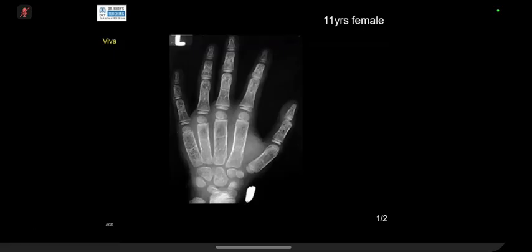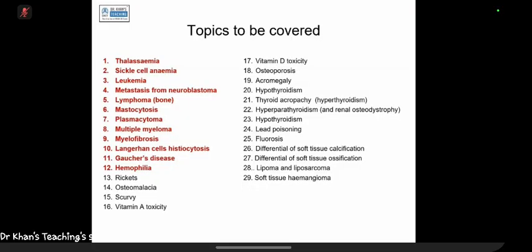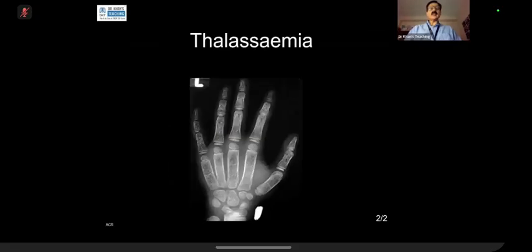Maybe extramedullary hematopoiesis. Like sometimes it's expanding. You see the word extramedullary hematopoiesis. I mean medullary, active bone marrow. So give me the diagnosis. This is active bone marrow in chronic hemolytic anemias. Okay. So this is a case of thalassemia. This is a case of thalassemia.